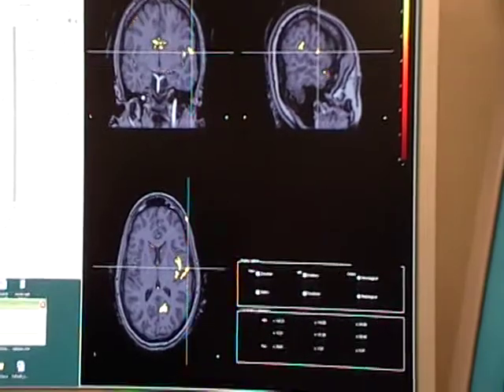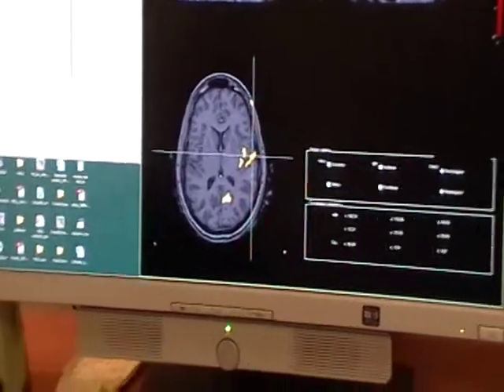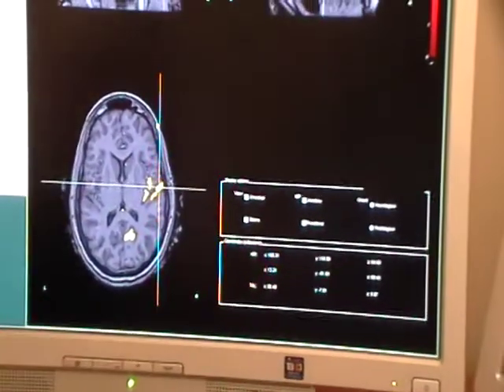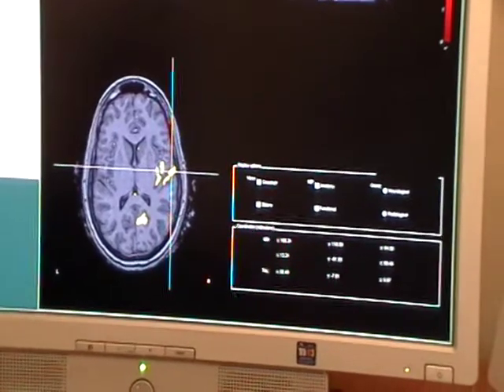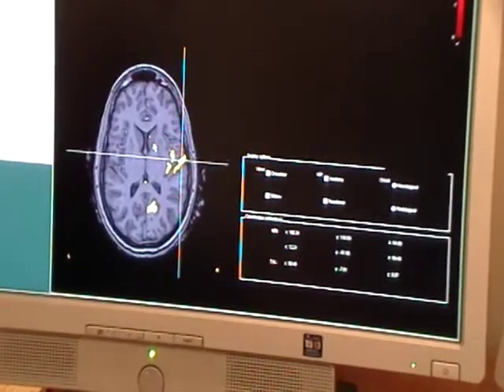But if we go back to the very original time points where the epileptic events have occurred, then we are able to pinpoint potential areas that are involved in the epilepsy. In that case, we see some areas to the right and another area here more to the left, to the posterior part of the brain.